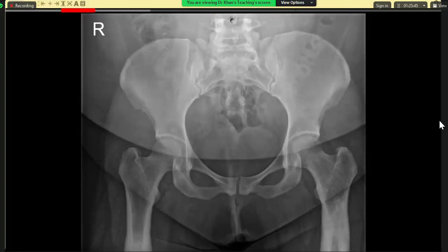Okay, sir. Sir, I'm presented with the X-ray pelvis, frontal projection of a skeletally mature patient, and the obvious abnormality I can see is cortical thickening and sclerosis along the visualized upper left femoral shaft. I would now look at the rest of the bones, which are grossly unremarkable. The sacroiliac joints and the bilateral hip joints are unremarkable, and the increased thickening and sclerosis is mainly involving the left, but I can also appreciate it on the right as well.